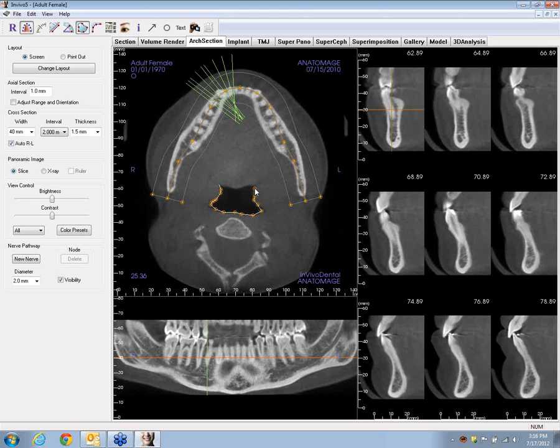Clicking points, and when you're through and you get close to the other end, we just double click or right click, and it'll close those gaps and give you the total area measurement of the included area. If we want to change this, again, edit it. All we have to do is click on anything to turn it red, and we can click and drag points as you see fit. And again, if it's red, you can delete it.